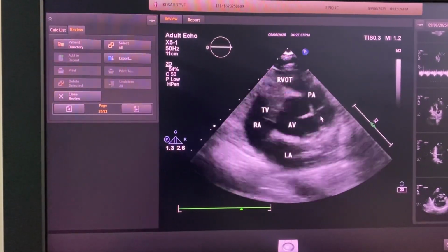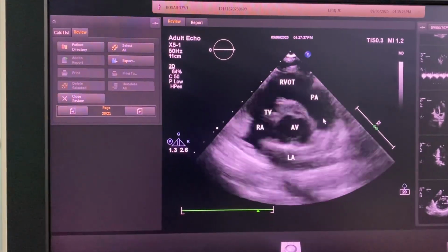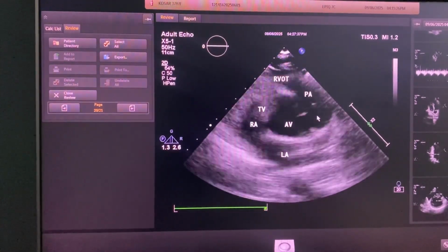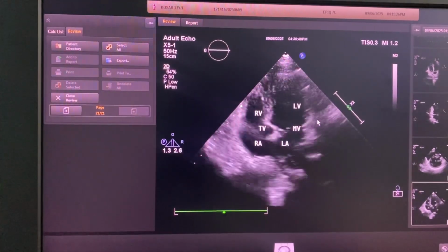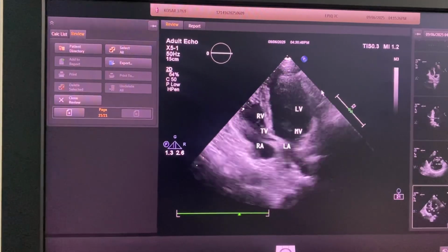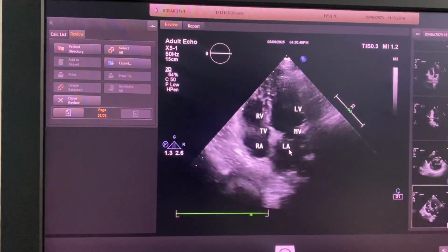One level of short axis remaining, the level of papillary muscle. This is the anatomy. This is how it should be labeled. So when you're watching, when echo is being done or you're doing it, this is how it looks. This one is the four chamber. It's not clear, but this is the four chamber.